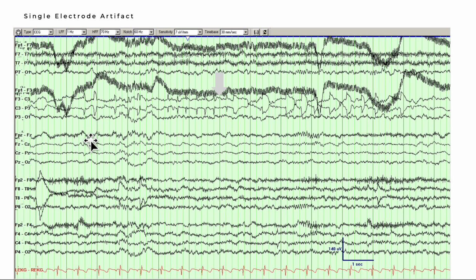And what it looks like is this. So see how it's the C3 electrode that's high impedance, but you're basically seeing that there's this mirror image created by this C3 electrode being off in terms of high impedance. And this is very common in EEG, and sometimes it can make the discharges clearly look like positive phase reversals in between them, but sometimes negative.